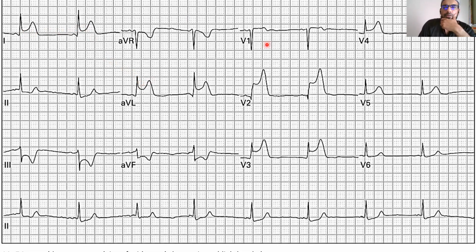All right. So if you were now working in your emergency department, you would describe your myocardial infarct, because this is a myocardial infarct based on the areas that are involved. So this is an anterior infarct combined with a high lateral infarct. Okay, so those are the two parts of the heart that are involved. So this is the left anterior descending artery, and the majority of the blood supply is actually going towards this area. So this means this is a massive infarct. So we would again stratify our patient now as high risk.